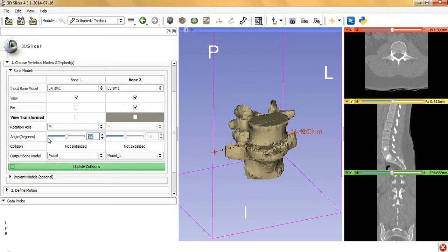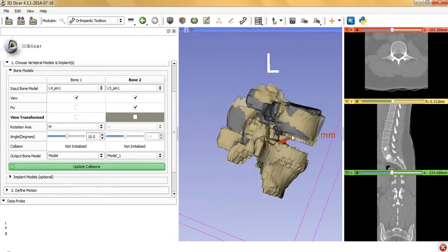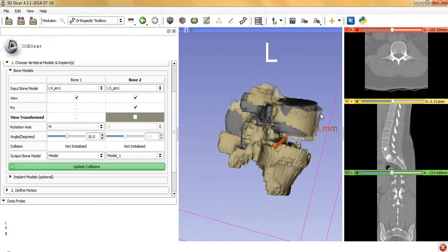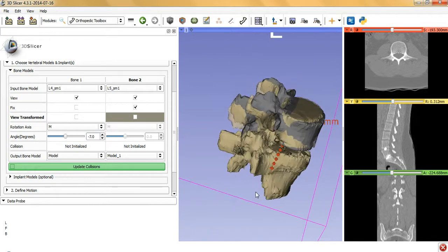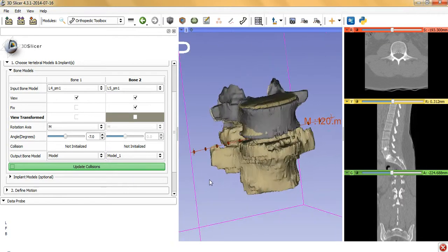And so now let's just assume I want to rotate 10 degrees in extension there, and you see this gray is what 10 degrees in extension is relative to what it used to be, this opaque surface, if you will. And it's pretty basic. You just toy with it, move it around, and it does what you're expecting it to do. So that's essentially it at the moment.